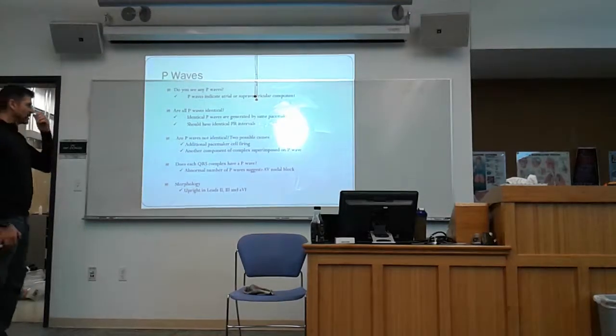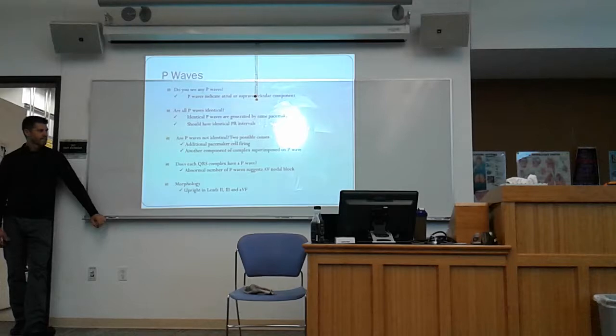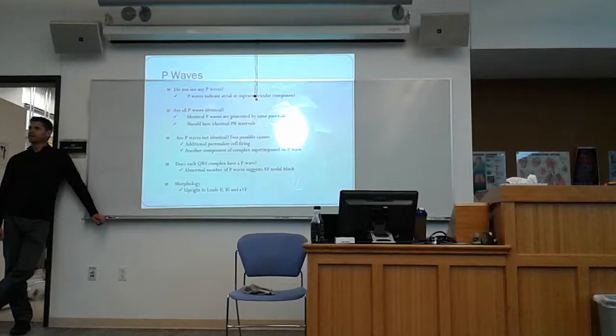Because remember, the EKG is just a compilation of the average of everything that's happening. You're talking PAC? That is one possibility. Not really a PAC, but the T wave from the previous one on top of a PAC, yes. Something's happening.